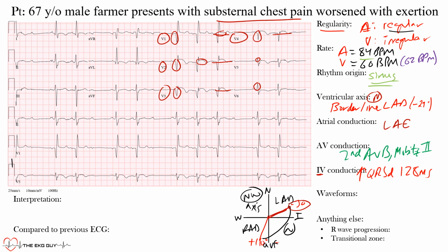Okay, so that's still expected and maybe not involving that region of the heart. So that's what I want you to see here, is that there's an anteroseptal infarct in those leads. And that's likely an acute one, not an old one, because you have associated ST elevation changes. Obviously, you want to look back at a prior EKG, and actually these are new changes.